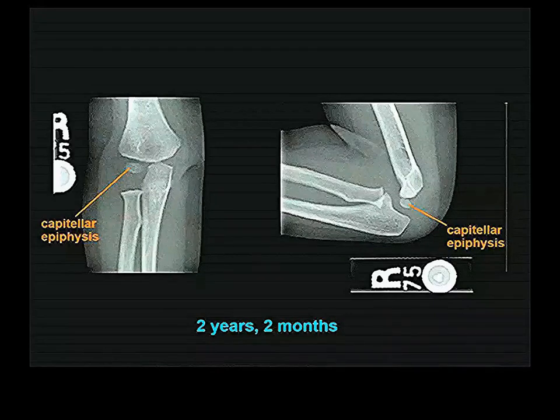There's the diaphysis of the humerus, the diaphysis of the radius, the diaphysis of the ulna, and these bones develop epiphyses, distal epiphyses for the humerus. We looked before at proximal epiphyses of the humerus. The humerus has a couple or three or four maybe distal epiphyses. The first one to form, you don't need to know timing, is the one for the capitellum, which is the part of the bone that the radius articulates with.